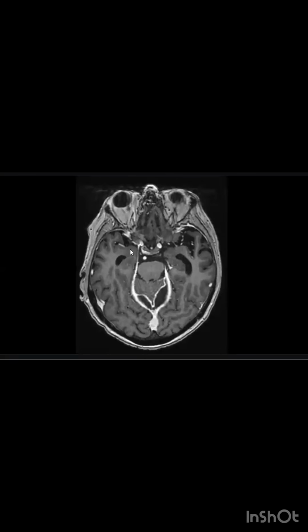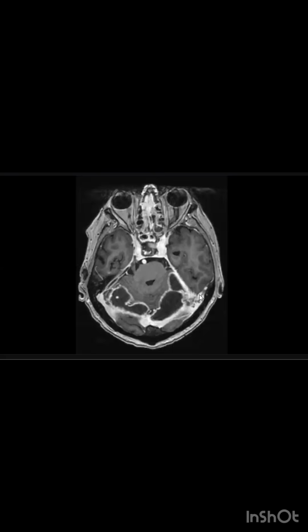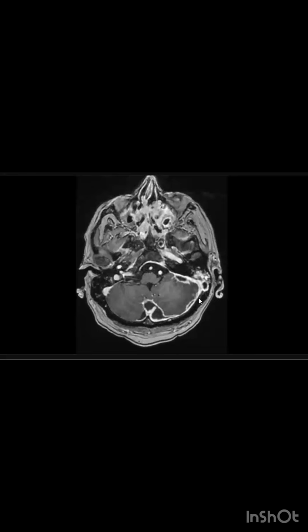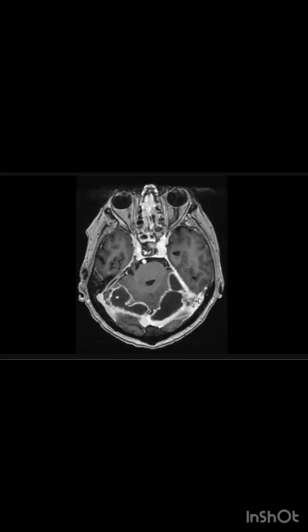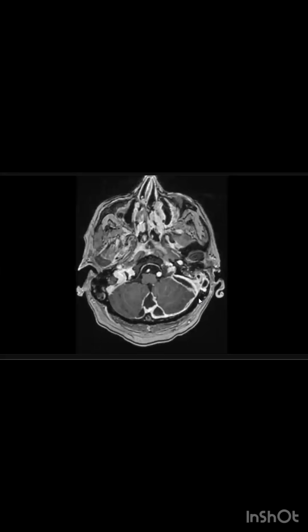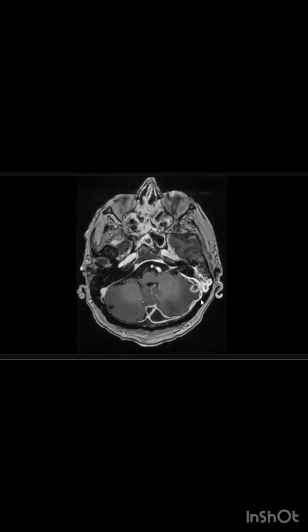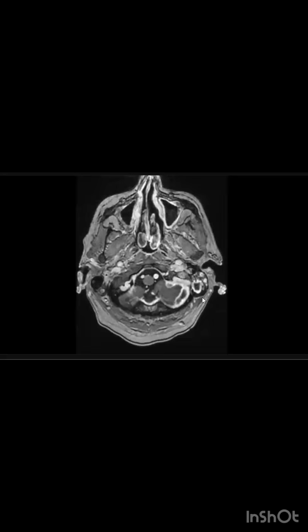All right. So these are hyperintense collections noted along the tentorium cerebelli on the DWI images. I would like to see the ADC to look for diffusion restriction. On the post-contrast images, I can see ring enhancing, peripherally enhancing collection formations noted along the posterior fossa, along the tentorium cerebelli, and I would like to see the sigmoid sinus.